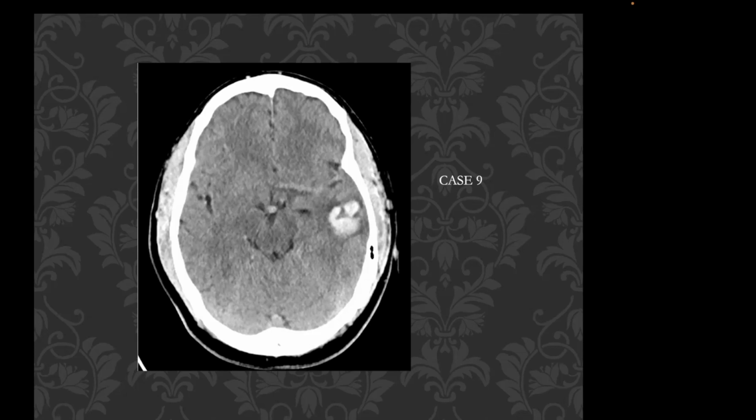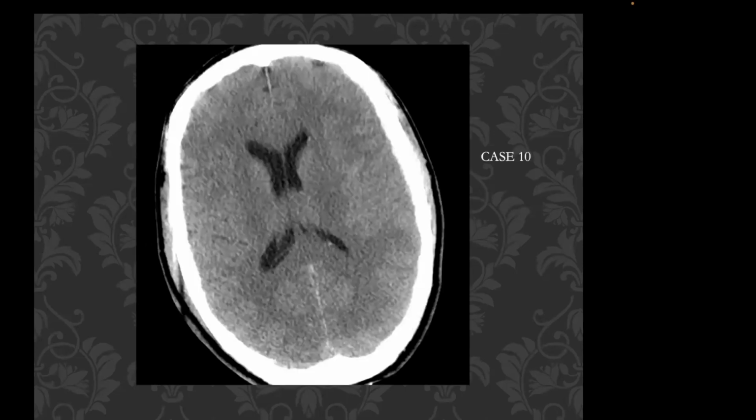Again, something to keep in mind as you work up these patients with intraparenchymal hemorrhage. And this last case, making the point that this patient actually has a subdural in this location. I showed you that in one of my talks, but it looks like it blends in with the skull because the blood and the bone fall into the same range outside of the selected window. A lot of times for CT demonstration, we use a window of about 80, but you want to look at it again at a window of about 200 to be able to pick out these small subdurals along the skull.